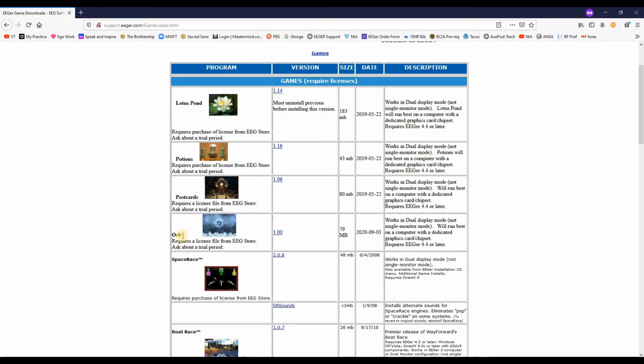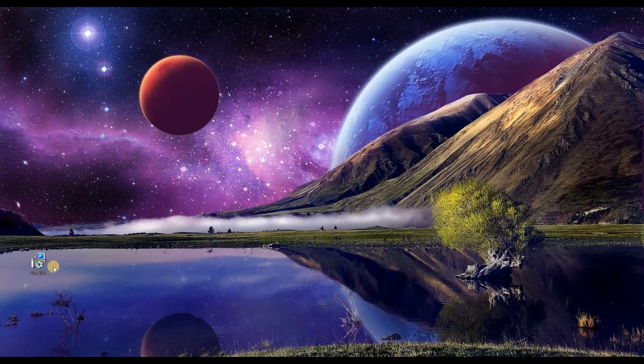So let's say you see this game, Orb. You've been hearing about it, you go, ooh, Orb, what is that? I'm interested in that. I'm intrigued. Let's try it out. So you click on that, and then you save file, and then it starts downloading. But you know what? I'm going to cancel that download because here's one I prepared earlier.